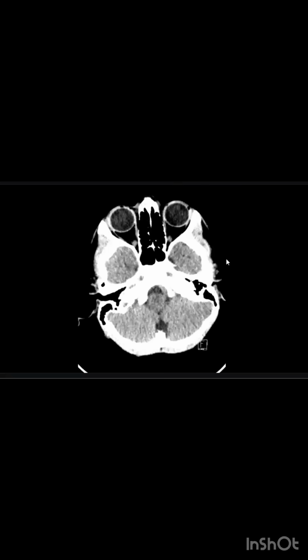You can scroll. Click once and scroll by your trackball. But it's not responding. Click once and scroll by up and down arrow.